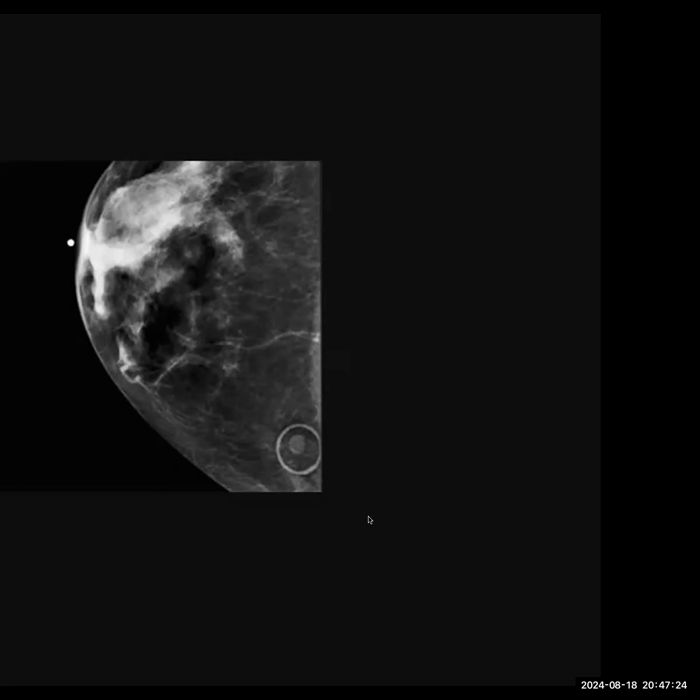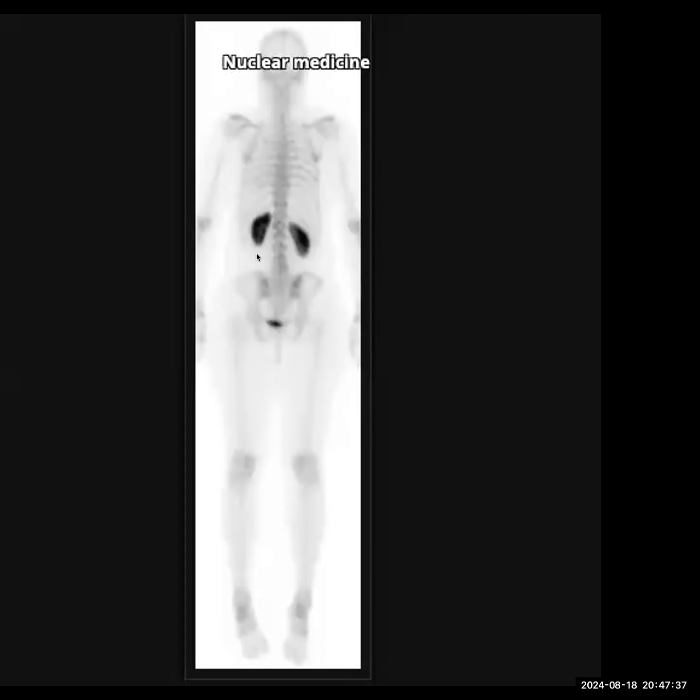So when you see a circular marker over a lesion, understand that this is a lesion in the subcutaneous plane and it's just a mole. Nothing needs to be done in this case. Okay, now I think another case was this.